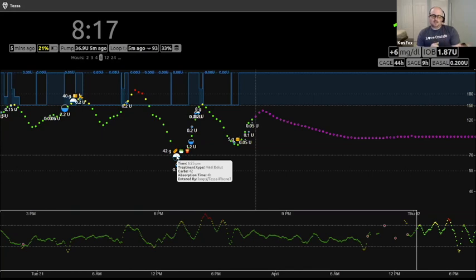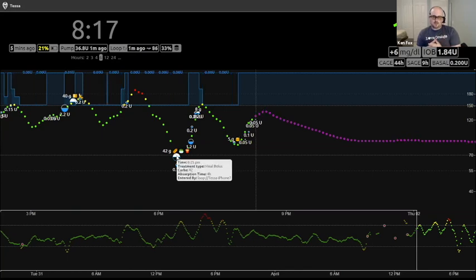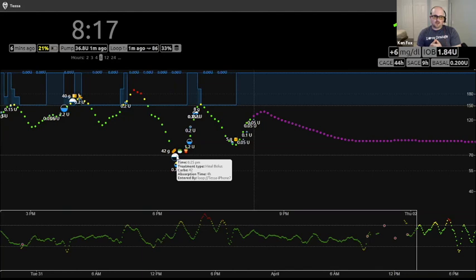You actually can't see it in the reports in Loop either. So unfortunately, the only place to see those right now is right here, hovering over the carb icon or any part of the carb circle or the name up here, the 42 grams and the pictures. So if you have some entries overlapping each other, if you can get your cursor on one little piece of the top there, you'll be able to see that hover over.